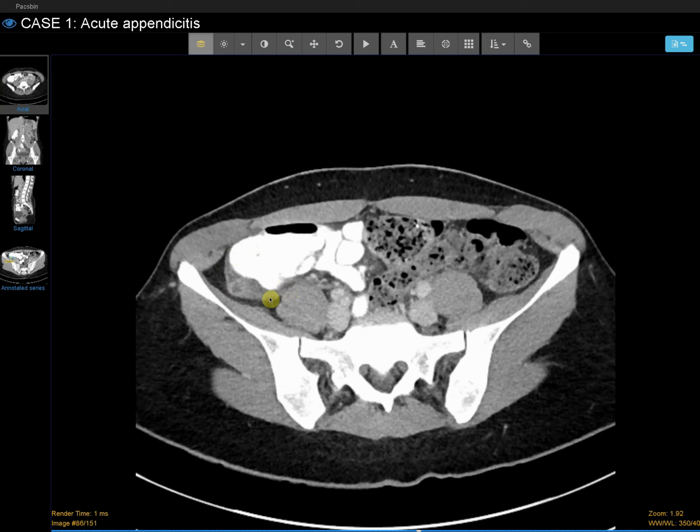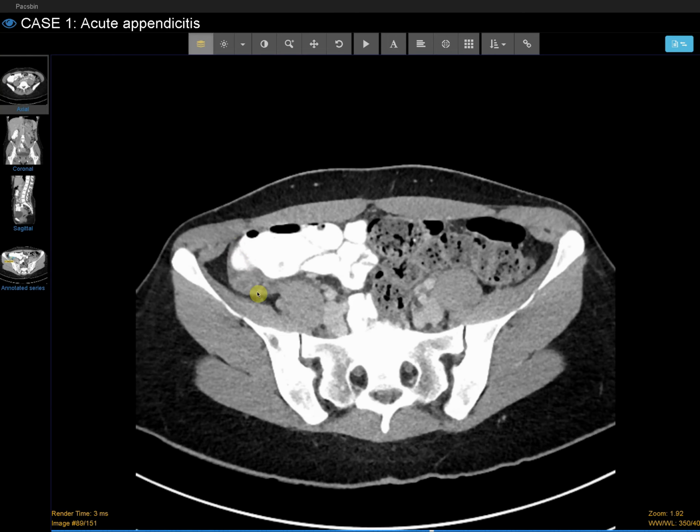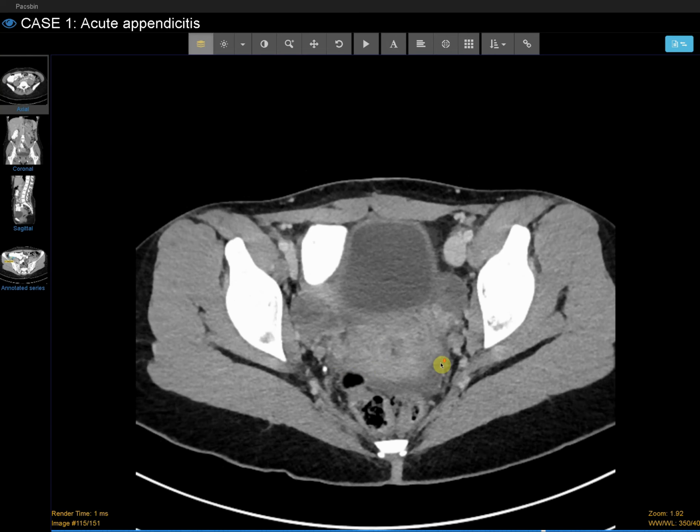In this case, I do see something that alerts me. I told in my previous video that the most lateral and posterior wall of the abdominal cavity would usually be the ascending or descending colon. If you look at the descending colon right here, the wall is thin and there's nothing behind. In our ascending colon, we do have contrast, but there's something thick behind, something around, which could be an appendix. So I look in this area and then I go down and look in the pelvis for ascites. In this case, we do have ascites here.